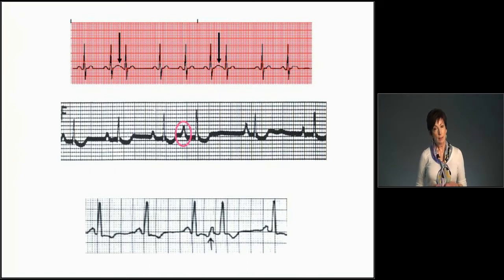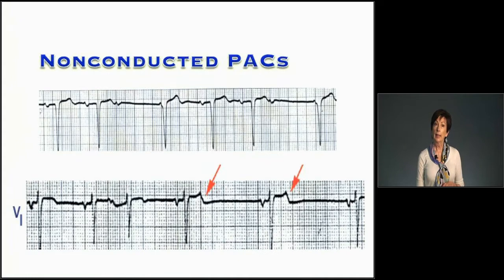And one of the causes for a sudden onset of PACs is pulmonary congestion, congestion that produces a lower PO2. So keep that in mind when trying to determine what could possibly be causing a sudden onset of arrhythmia. So lower than normal PO2 is one of the reasons that someone would develop PACs. All right, so then let's go and take a look at PACs that don't conduct.